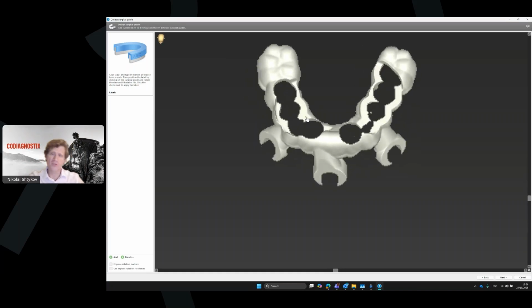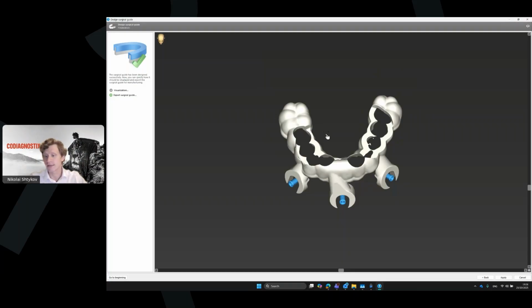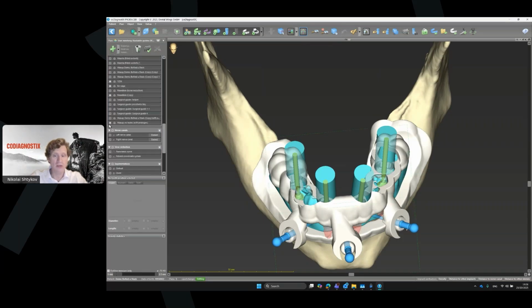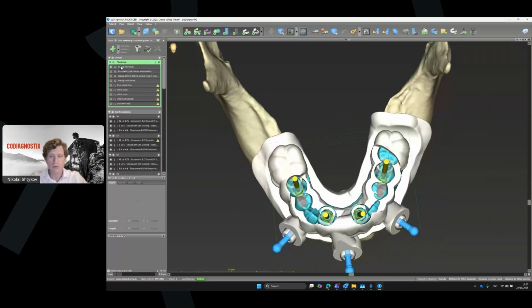Actually, in this kind of design, we could have some place to hold the prosthetics, and we still have the holes for where to put the screw and to put the glue when you connect your copings with it. So right now, we don't need this model as well. Let's turn off everything. And this is the way how to create this cage.